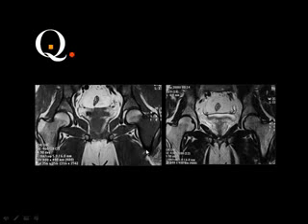Then why is this more black compared to this one? Yes, what do you think? Patient position in relation to the coil, and that's all. How can you confirm this? By the STIR image. Whenever you have the STIR image, you got no brightness at all. Then you know that this is the residual red marrow.